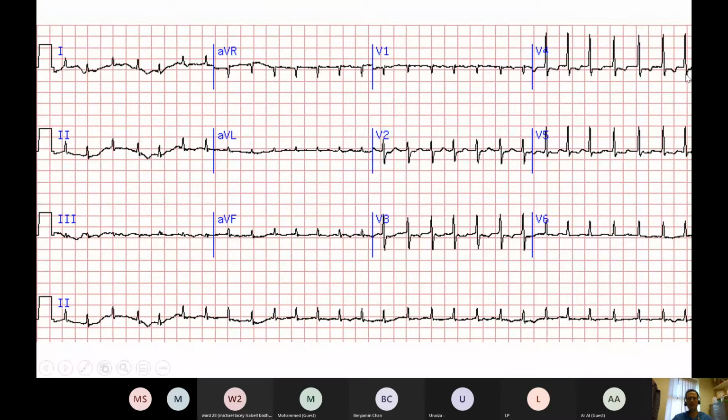So thank you. You can't see a P wave, bit irregular, not sure. Another person saying it's fairly regular. Yeah, I think it does look fairly regular, doesn't it? So this is an example where it's very hard to eyeball this and say, is it regular or irregular? Whereas if you draw your lines on, as I showed you a moment ago, and ratchet those across and try and line them up with an R wave, you can immediately see that this is actually really quite irregular.